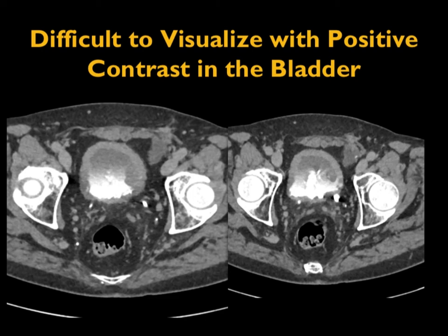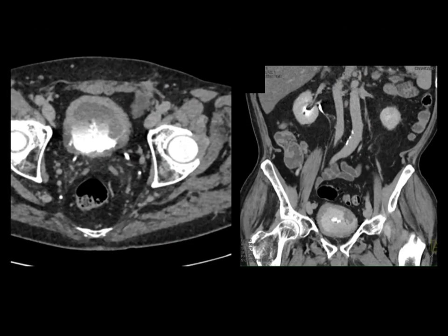You can see this case actually on the contrast scans is a bit more difficult to visualize. Water is a great contrast agent. Positive contrast works well in certain cases, but in certain cases it can make the images much more challenging, as it did in this case.